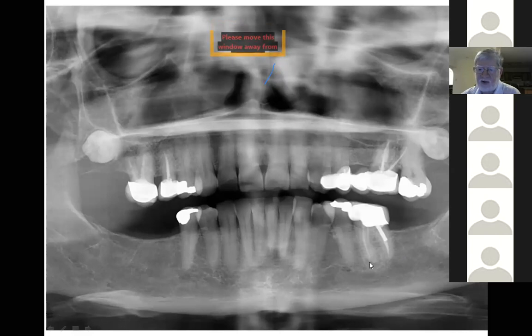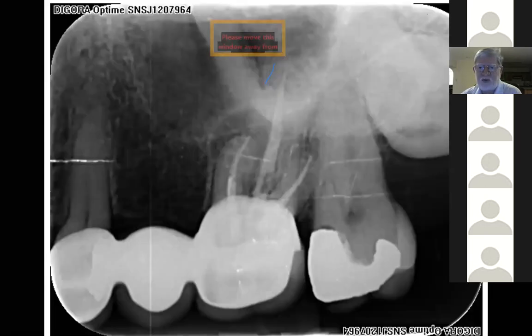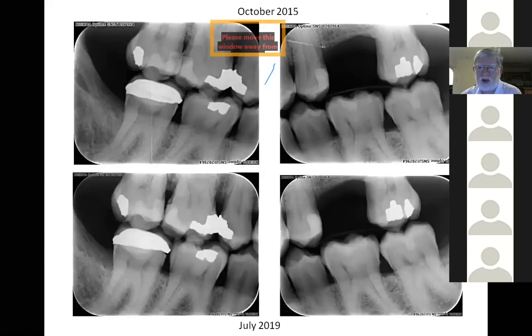An endodontist isn't going to revisit all of this, even though there appears to be no pathology there, because of the post. You may not want to subject the patient to an apicectomy. So are we looking at an extraction? And the patient may well turn around, and this is going to happen to you, and say, look, I'm 60 years old, I'm 70 years old, it's giving me no trouble, I will leave things completely alone. But then document your records, make sure it's documented.